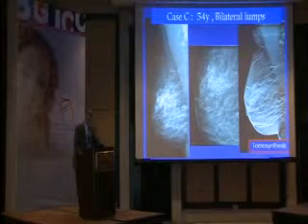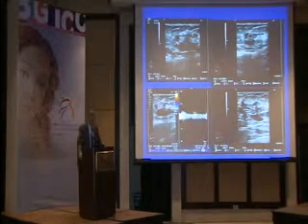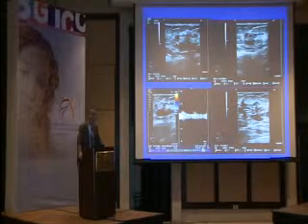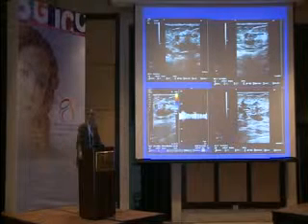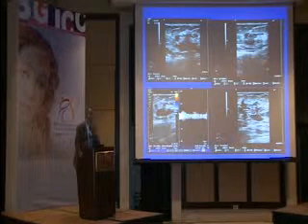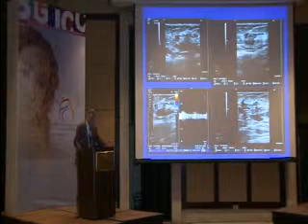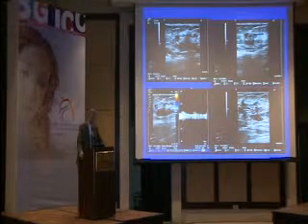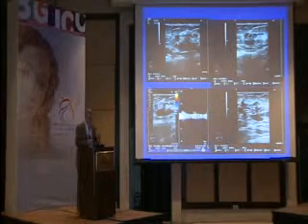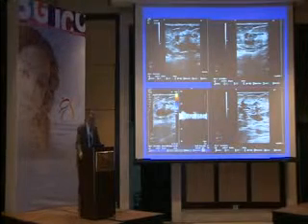And this is the ultrasound, again, of the pathology. And you can see here the ultrasound is really a composite mixture of maybe cystic and maybe solid areas or non-homogeneous area, whatever you call it. And it has vascularity with a resistive index of 0.64.